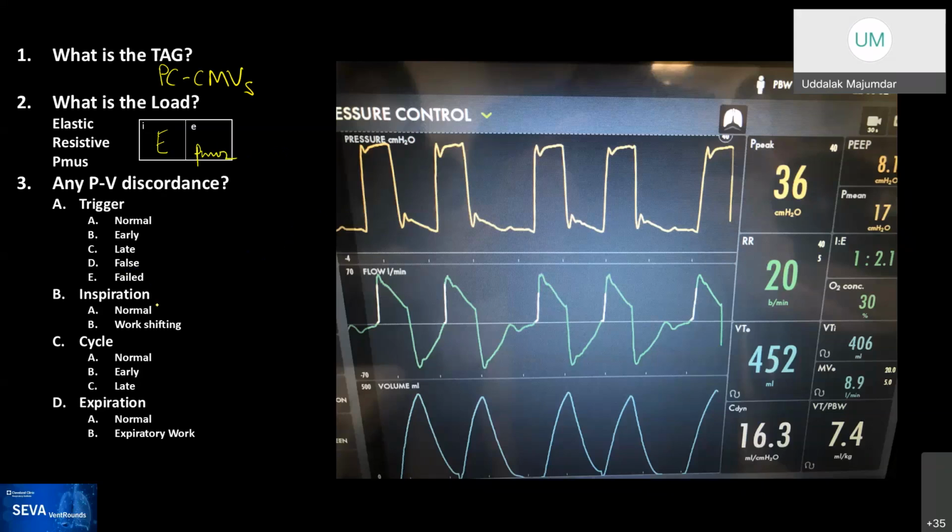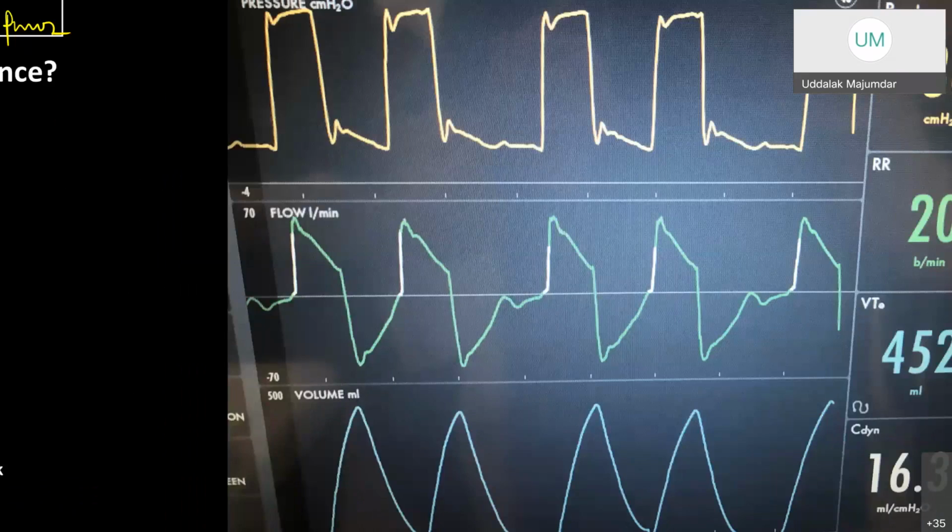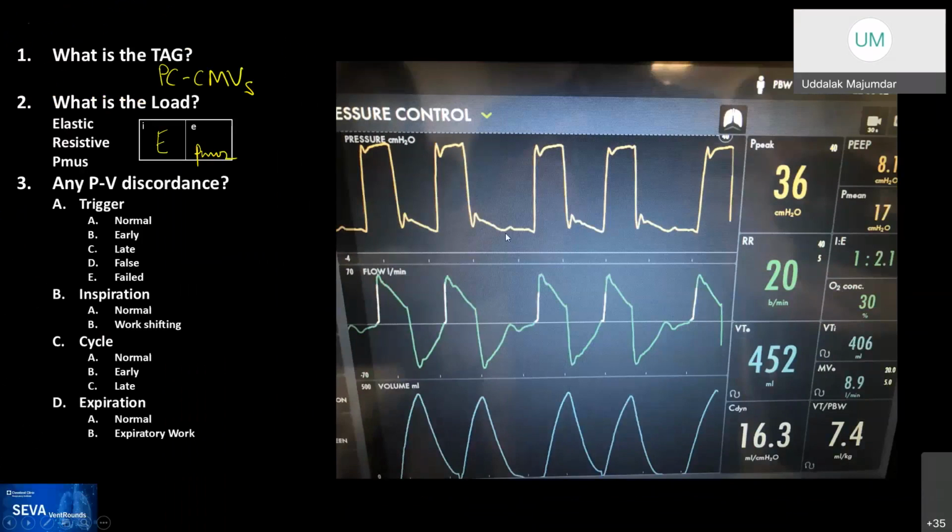First breath, triggers seem to be normal, but I'm trying to see in the third breath what's happening, because it's going down. The flow is going down to the baseline, and then there is still a negative deflection, which means the patient's breathing out. Okay, and then the patient takes a big breath. So if the patient's still breathing out, means the patient is still exhaling. And there's also a positive pressure deflection on the pressure waveform. Yeah, so it is deflecting. It's not playing a trick on me.